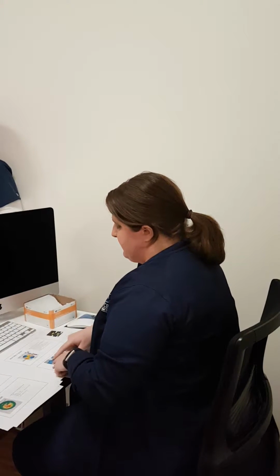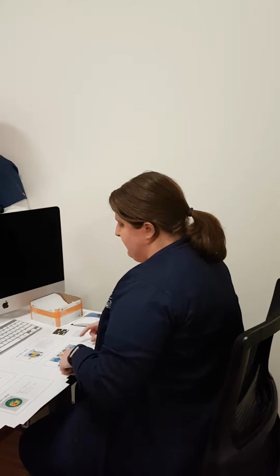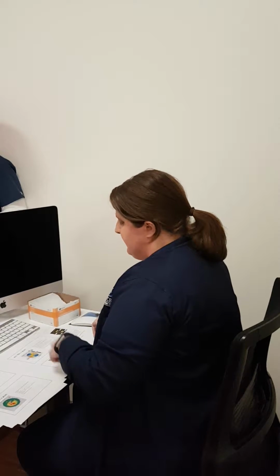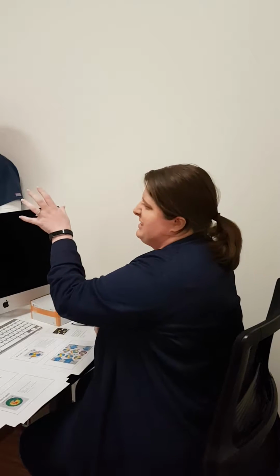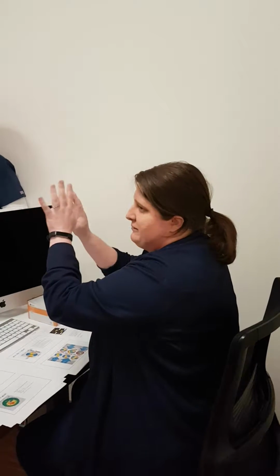Regular should be fairly symmetric. Obviously the picture up top is the perfect example, but you can notice on the top left of the slide, you can see that it is also normal, but it's just a little tilted, not perfect hourglass. That's still normal as long as there is that connection and it looks fairly symmetrical. Okay.